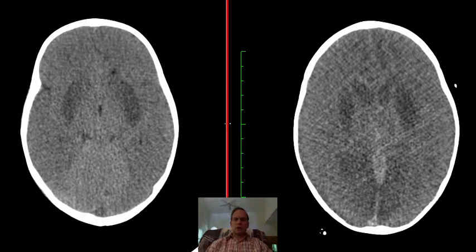Hello there, this is Dr. Mintz. This is a 3-year-old patient who had an anoxic event, A-N-O-X-I-C, an anoxic event. This means that the oxygen in their blood was diminished considerably for a period of time, and that could occur because of asphyxiation or strangulation.